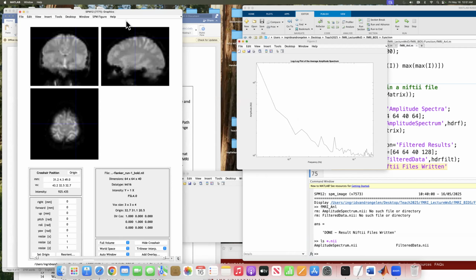And now the nice thing is that in this window, you can go through the data, and it will show you in the spatial domain how the different time steps work. So that's this dialog here. And you now see that the cursor is moving here, and while the cursor is moving, you can see that the images are being adjusted.